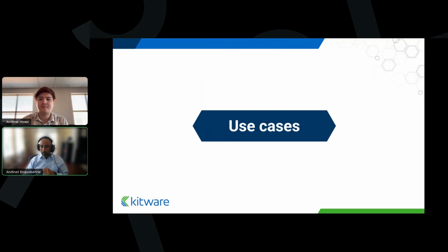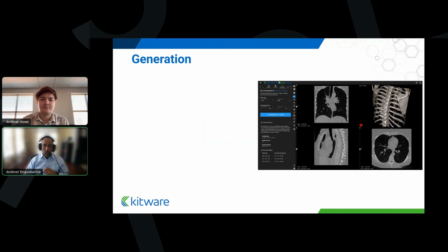Okay, yeah. All right, so let's just quickly go over three different use cases of VolView with NVIDIA Clara integration. So the first one is synthetic image generation. And again, here we're talking about very realistic, anatomically consistent synthetic CT and MRI data. So these are not toy images that kind of look and feel and behave like real medical data, but they're actually very high-fidelity, realistic synthetic scans.